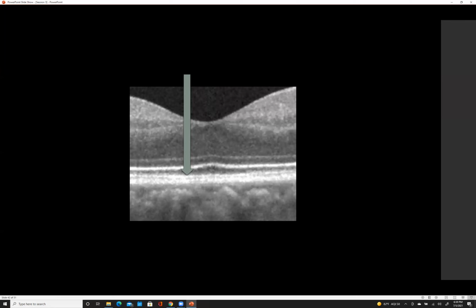And what do we call... so you're saying cones and rods. Remember, the entire photoreceptor is called a cone, right? You're talking about the outer segment, right? So just remember that. They interdigitate with the outer segment. Yes, so it's interdigitating with the cone outer segment or the rod outer segment, what have you. You got it. Okay. How about that one? The photoreceptor layer. Well, sorry, the ellipsoid layer. You are technically correct, but you're absolutely right. What is the ellipsoid layer made of? Packed with mitochondria. You got it.